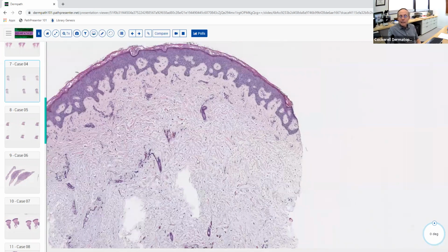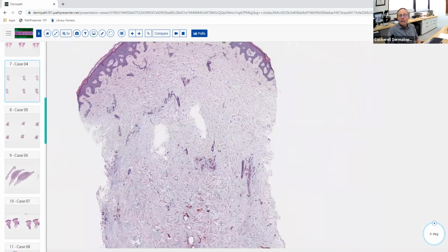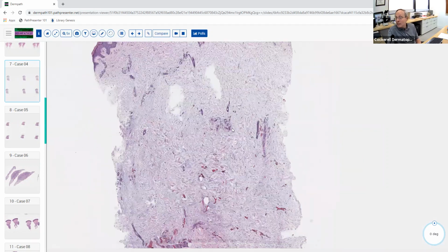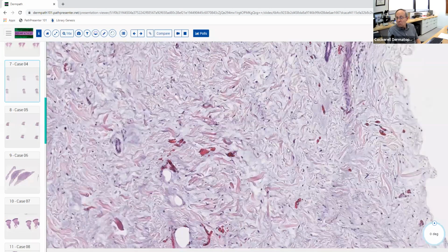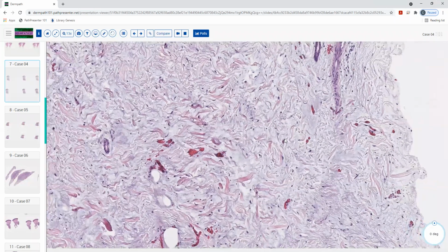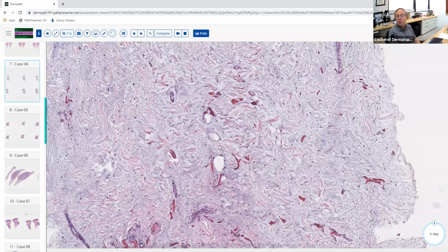So if this is on the leg and you've got this massive quantity of mucin here, what's the most likely diagnosis? Pretibial myxedema. Yeah, pretibial myxedema. Now, is there any neoplasm that this could be? Are there any neoplasms that produce a lot of mucin? I mentioned mixed tumor of the skin, basically a chondroid syringoma. And the reason it turns into cartilage is because the mucin undergoes cartilaginous metaplasia.